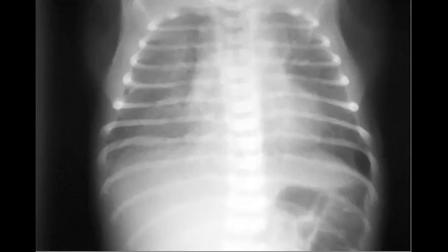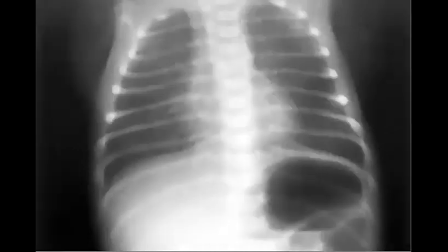Also, the nice thing that you mentioned is lung volume, whether it is increased, decreased or normal. You can describe it in two terms, either increased, or you can put normal or decreased in another category. So if you consider it increased, I will show you something that should be like the normal one.